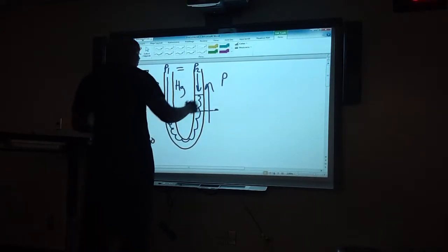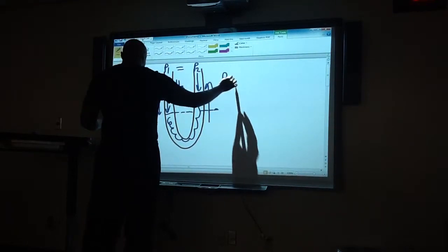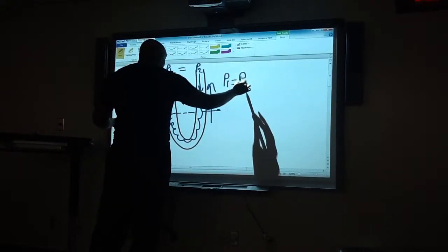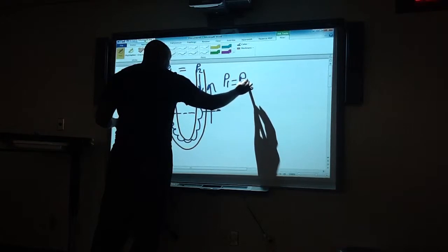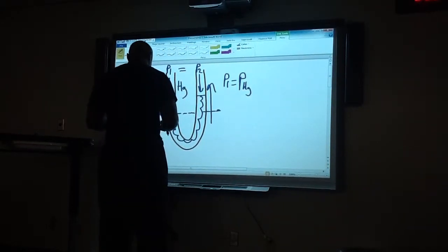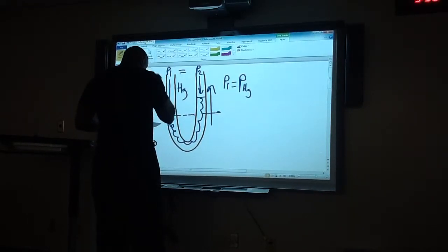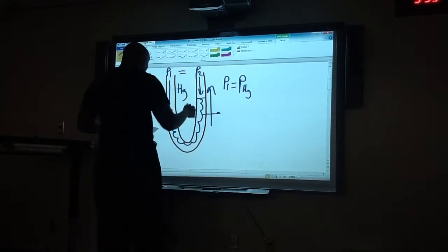So again, we demonstrate that this is causing some pressure through the mercury and on the mercury.